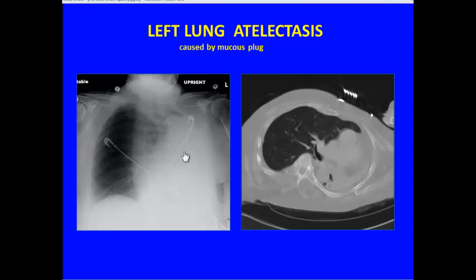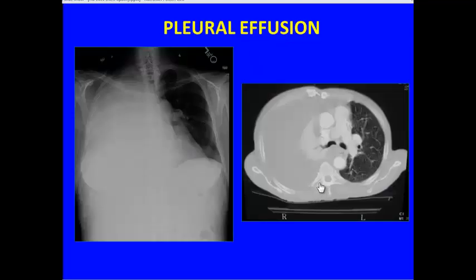Well, if we look at this one, we can see the mediastinum is shifted. The mediastinum is shifted towards the opacified side, and that's telling us that's volume loss, because the mediastinum is shifted toward the opacified side, and the contralateral side is hyperinflated. So this person needs bronchoscopy to try to get that left lung better ventilated.